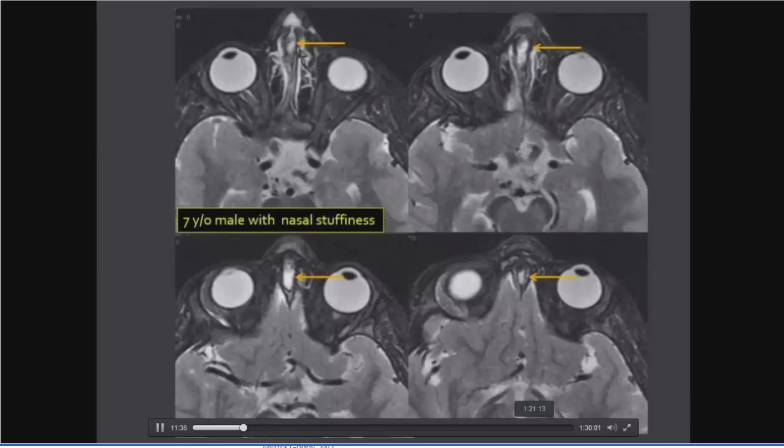There seems to be a T2 hyperintense lesion along the anterior midline nose, and you can track it up almost into the intracranial compartment. And this structure is the crista galli, and this is not a normal crista galli. It looks bifid and unfused in its anterior aspect. So right away you know that things don't look totally normal here.